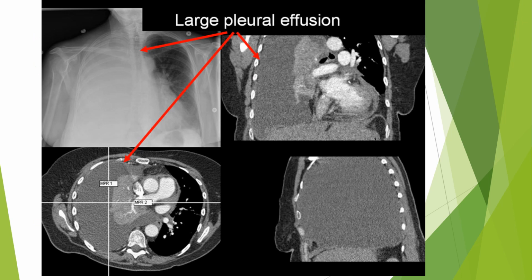So on this picture, you see a massive pleural effusion. Do you not see this? So up here is the X-ray, right? Pointing an arrow to it. Up here is the X-ray of this patient. You see how the whole right side is just like socked in. It's just completely whited out, right? Is that very diagnostic? Do you know if it's in the lung, outside the lung? Do you know from looking at that X-ray? It's very hard to tell.